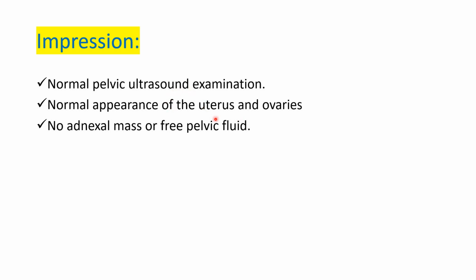So there are lots of things that you can miss when you don't mention one specific organ when you're doing your pelvic ultrasound scan. So it's very pertinent to the referring clinician. Don't just write this without checking. Make sure that you do a thorough assessment and make sure everything that you document has been checked. Otherwise, you're going to miss pathology. So you see, these are the building blocks of pelvic ultrasound.